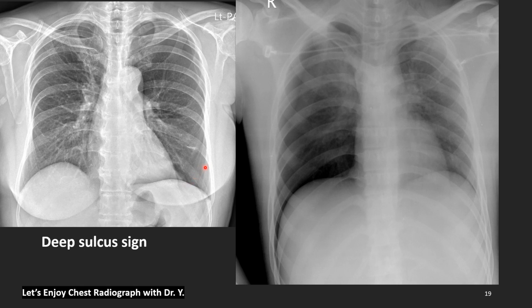So this is pneumothorax. And especially this diaphragmatic line is more evident to our eyes. It's a kind of Mach band effect. I'll tell you later if I have time. The pneumothorax is large enough to show at the apex and lower portion. So the costophrenic angle is going deeper, especially on the AP supine film. Actually, the diaphragm is inserted deeper than we usually suspect.